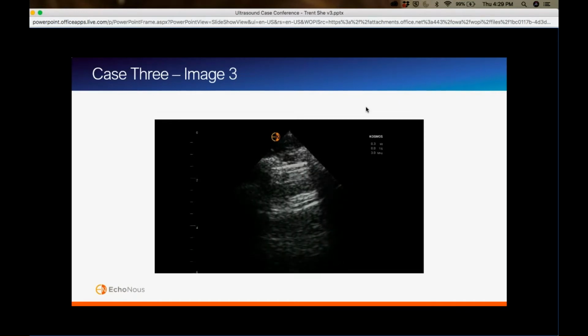But there are some sparse reports that in severe asthmatics like this with prolonged expiratory phases, you can see very minimal movement of the lung. But I think in a patient with cardiac arrest, this is one of the things that me and my residents were going back and forth on. It's like, do we just go for bilateral finger thoracostomies into chest tubes? It was really difficult.